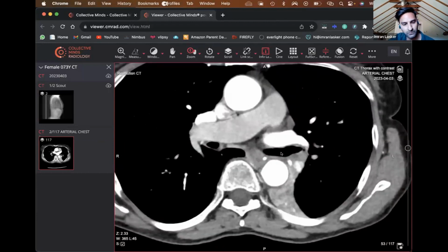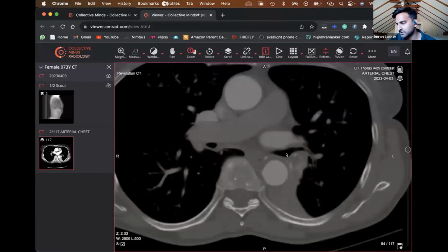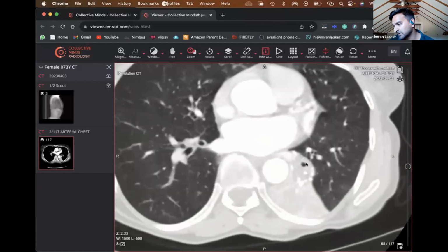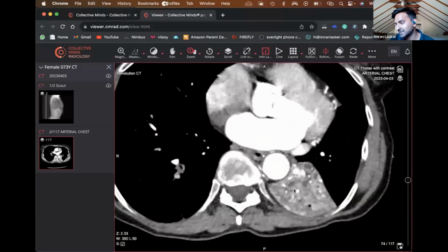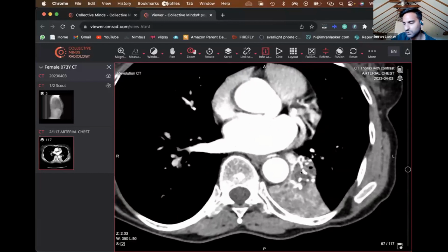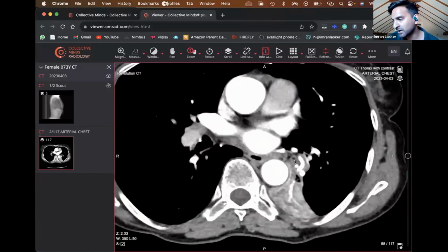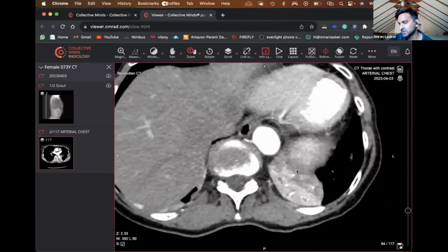You can know this because if we go to the lung windows, like here, you can see, oh, that's the bone windows. I should know the lung windows by now. You can go down and see that airway, and you follow that down, it becomes gunky, then more airway, then gunky, and then disappears. When you go back to the soft tissue windows, you can see there's vessel, there's airway, there's vessel, there's airway. These are all separate and full of what looks like fluid. So there's extensive mucus plugging. It's gone all the way to a more central airway, and has resulted in what looks like collapse/consolidation of the lung.